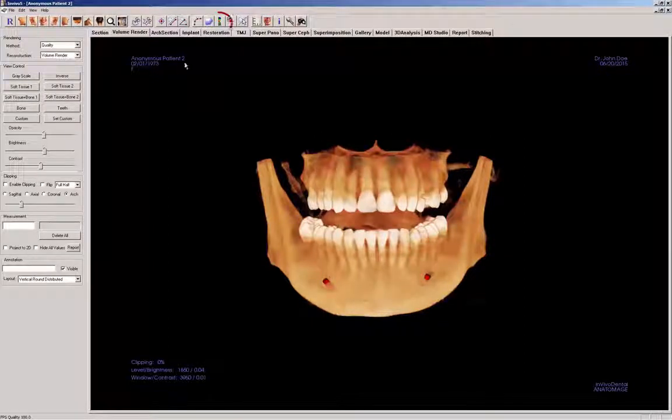The airway measurement tool also shows a positive airway view, which is color-coded based on area. This inverse method lets you see the airway without color coding. It is a much easier tool to use for airway assessment than the volume measurement tool. The airway measurement tool measures the airway volume as the section view tab airway measurement tool does.